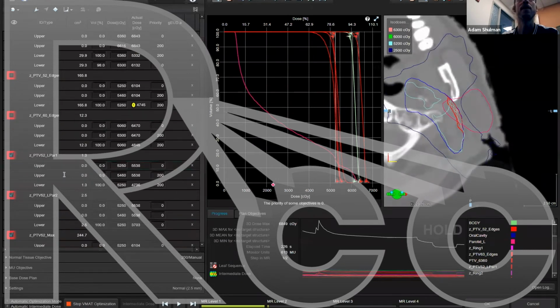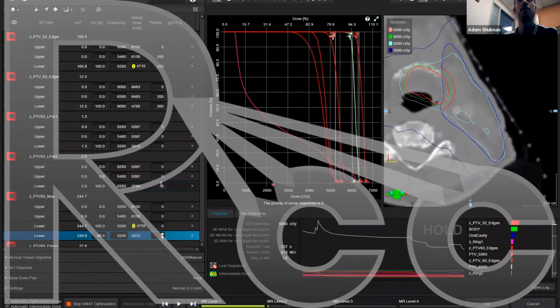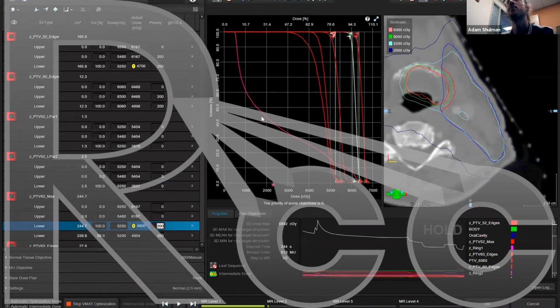And make sure I've got, sorry, I didn't take this off. It hasn't gone down yet because I didn't remove these. I removed the wrong one. Apologies, everyone. That's why the parotid didn't go down. So now you can see these are those two little 2 millimeter sections of parotid. I just removed those so they can go down, but still keeping my coverage on the rest of it.